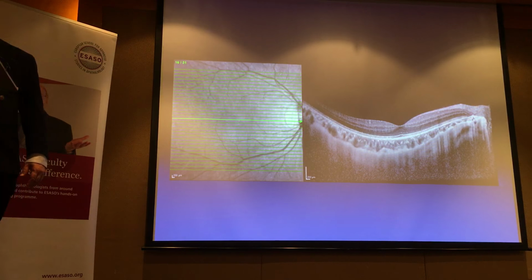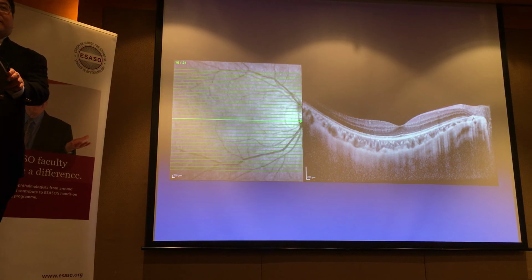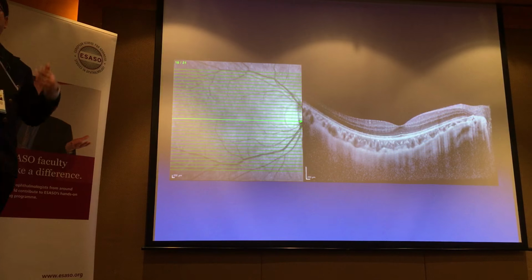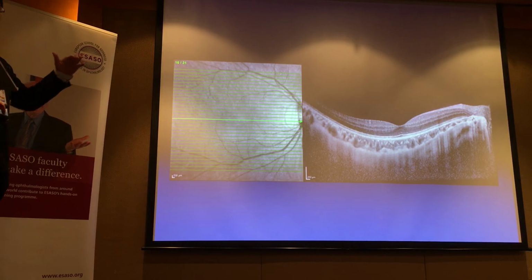Do you take the subfoveal region only, or do you measure the thickest part? Typically, I think you need to have some frame of reference. So if you're taking one measurement, I will take subfoveal. What others have done, and we have done, but it is very time-consuming, is to measure at specific distances. I would say 500 microns laterally on either side, and then measure down again. So 500, 1,000, 1,500 microns, and so on. But it's very time-consuming, and that will be only for the horizontal cut, presumably. Some have done horizontal and vertical.